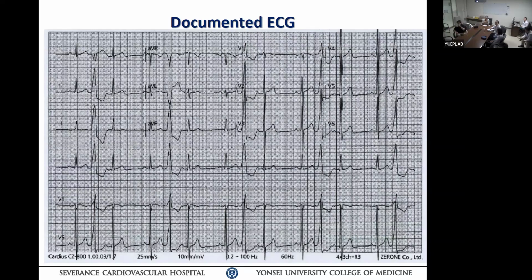Imagine the tissue coming from the deep side, slowly activating. And once you hit the endocardium, it activates the fascicles and goes down. Can you imagine that? It's a deep focus, not an endocardial focus. That much you can tell. The question is whether this meets the criteria for an epicardial source or not. Probably not. Not quite enough.